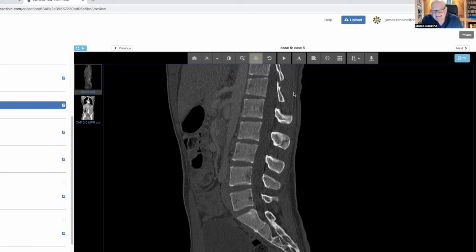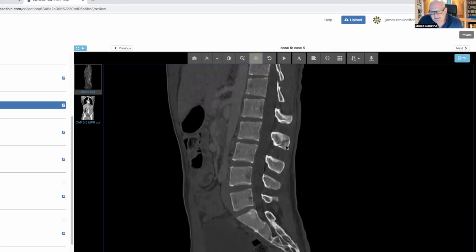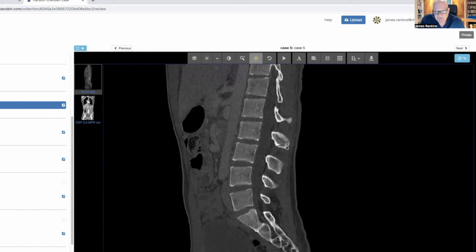And so it's very easy to cleave off a tip of a spinous process by compressing it between adjacent spinous processes. And that happens with true axial compressive fractures down through the spine. So you'll frequently see multiple, in fact, thoracic spinous process fractures. Now, if you look at this here and try and decide, well, firstly, I can see it on all the sagittal slices, so it looks like it's a horizontal fracture, although it's slightly obliquely orientated.